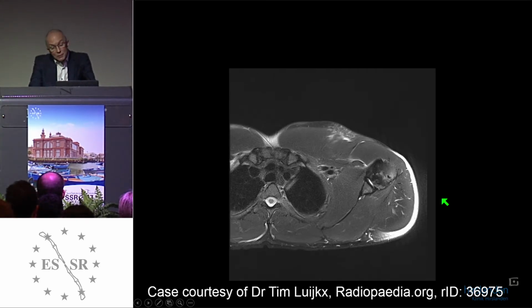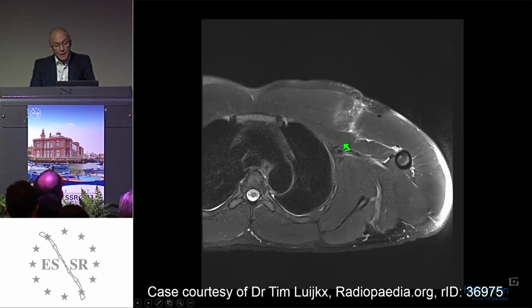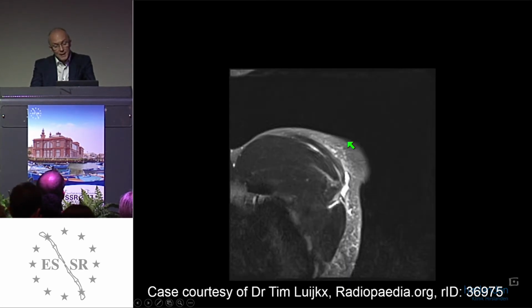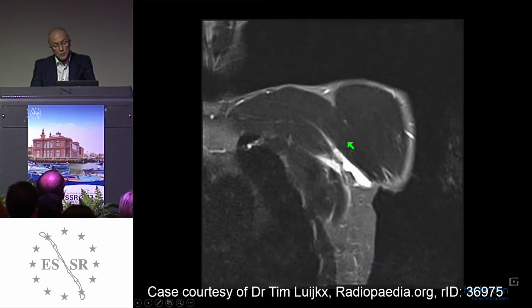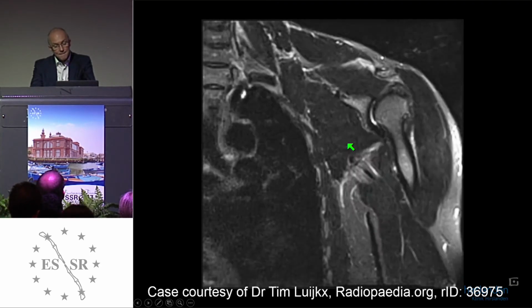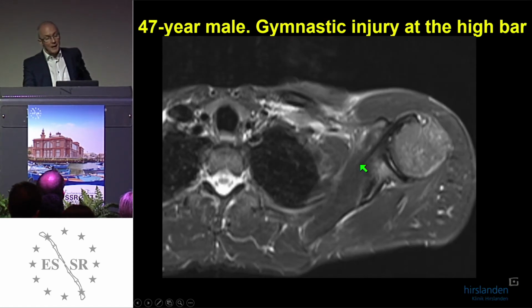So with that, I would like to demonstrate two further cases only to familiarize you with this diagnosis. This is from Radiopaedia. You see here the tear, and we can follow it when we are going down on this side. This is the coronal view. And these are now further cases I would like to demonstrate.